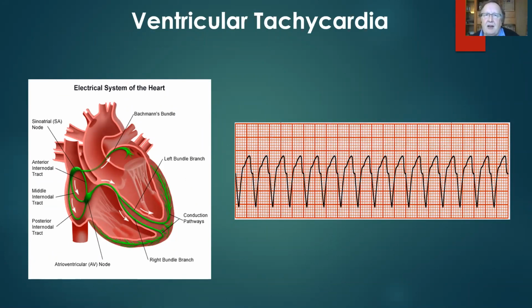Ventricular tachycardia. Here, no P waves present. We have a fast rate, it's regular. But first question has to be, is our patient breathing and do they have a pulse? Because if they haven't, and we see this on the screen, it's defib time.